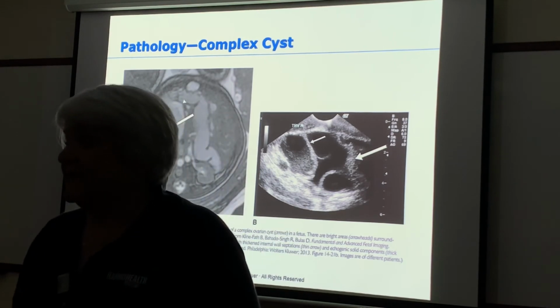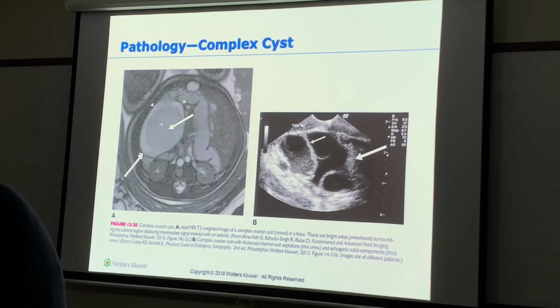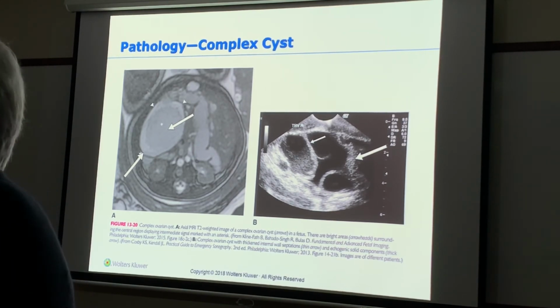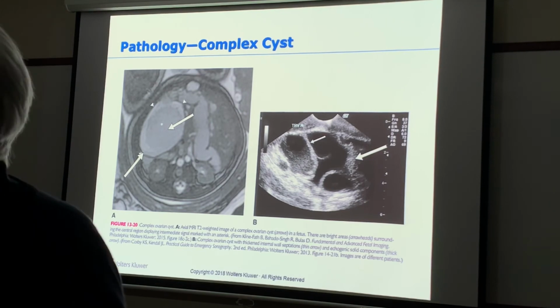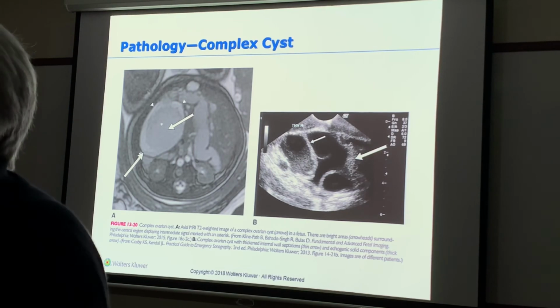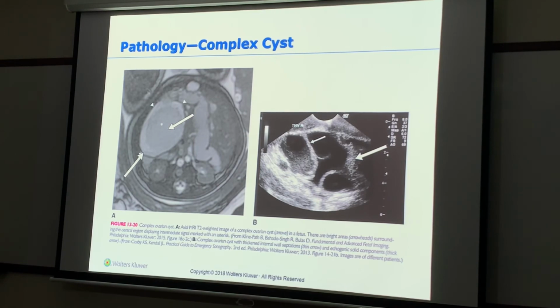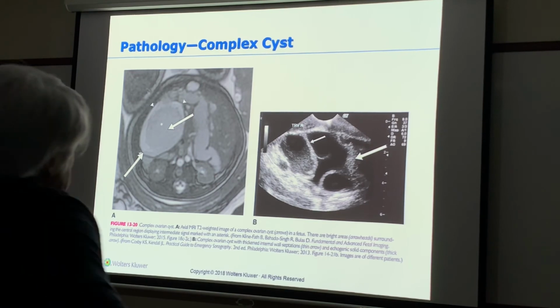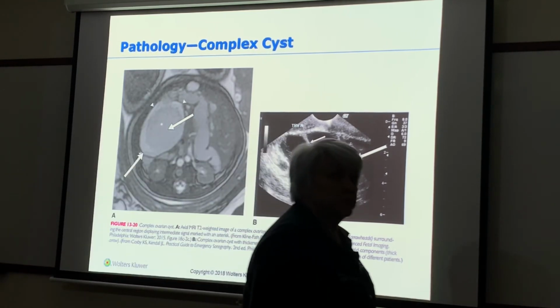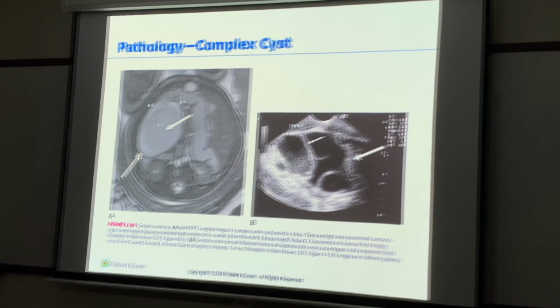We don't know, but we know it's either a serous cystadenoma or serous cystadenocarcinoma, or a mucinous cystadenoma or mucinous cystadenocarcinoma, because it's up to this level. Here are my kidneys. So that's one huge ovarian mass to be that high. So it's come from here.